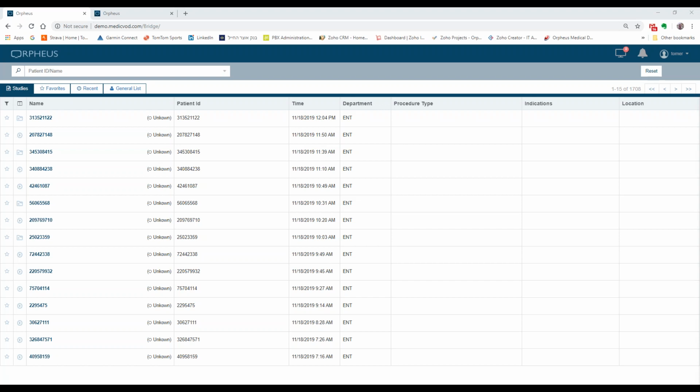It's good to know that they can do this in Orpheus as well. And also that the way Tomer explained, they could do additional annotations in Orpheus without sending those images with annotations into Lumens if they just wanted to annotate and put that image on a thumb drive or something for review or training or presentation or whatever. But generally speaking, annotations were understood to be done in the Epic Lumens site.